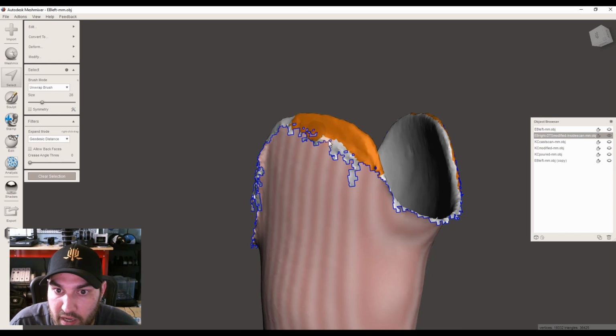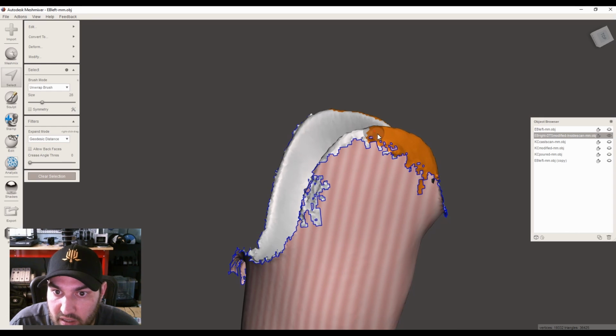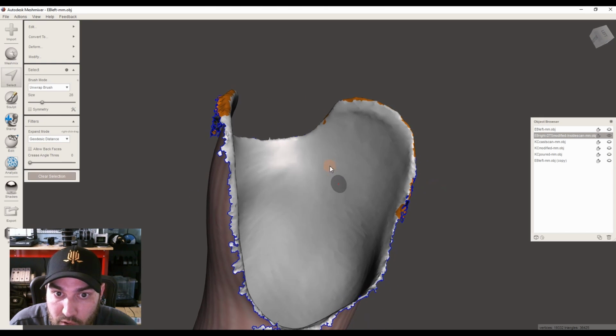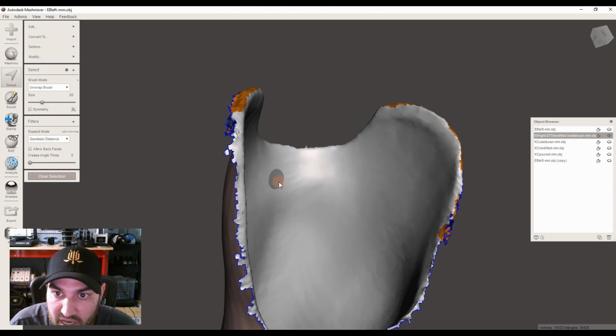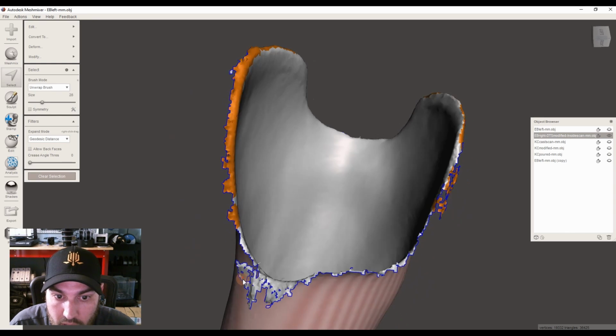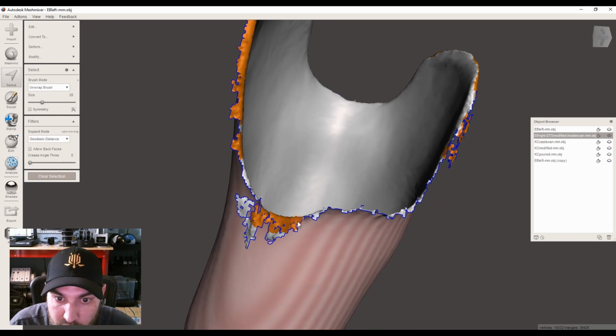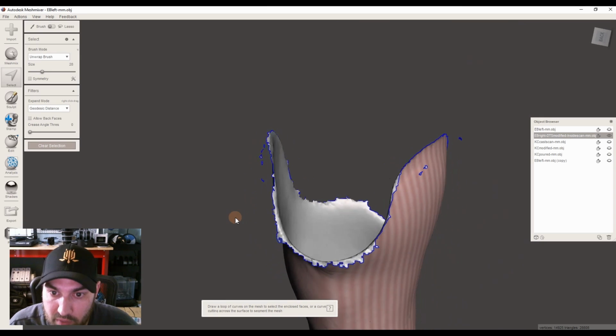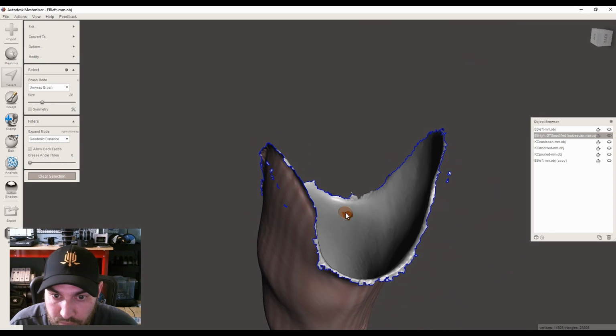So this was a first test socket going to second, or if you wanted to leave that test socket on your patient and go to definitive, you could scan the inside of that test socket and then work from there. So being able to do that really opens up some options. You can get creative and figure out how you can best use these tools now.